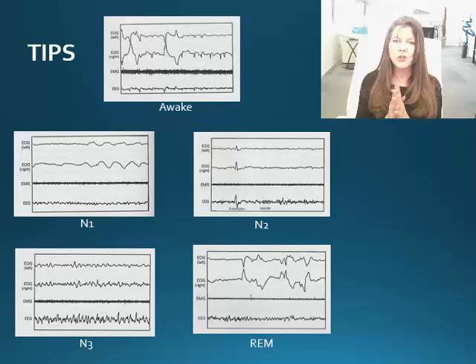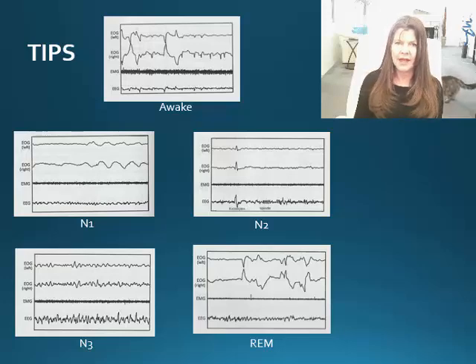Now stage two, a lot is happening here. It's a really interesting stage. Notice no eye activity. What we see here is not a blink, okay? What you see there is not a blink because it is not symmetrical. So it's just a reaction from the K complex in the EEG below. So notice this great big K complex going on here in the EEG. Remember that K complexes and sleep spindles are characteristic of stage two, the best way to recognize it.